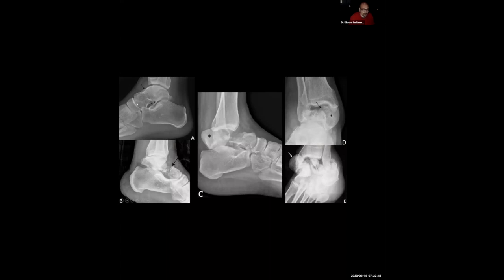Pretty straightforward. To provide some examples of lower-grade to higher-grade lesions, from the top left of our image to the bottom right, type 1s to type 4s, we can see a non-displaced fracture, a type 1, versus a comminuted and really displaced fracture with involvement of all the articular surfaces, talonavicular, tibiotalar, and posterior subtalar joint, all dislocated and displaced, a higher-grade injury. The higher-grade Hawkins-Canale classification fractures have been correlated with a risk of avascular necrosis, infection, malunion, and obviously subsequent osteoarthrosis. So if you know this classification and are able to provide it, it may help your surgeons.